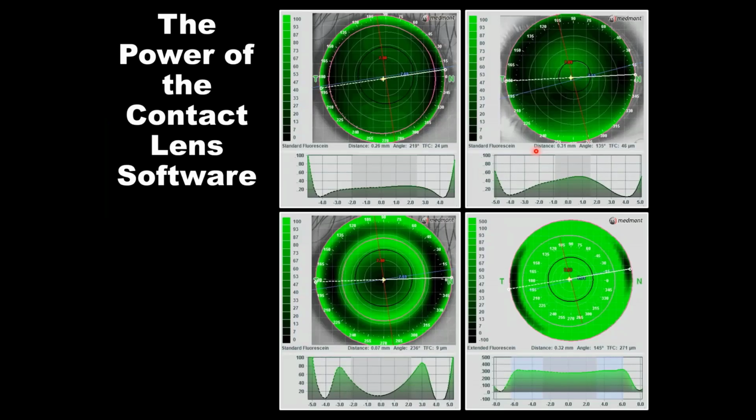Now, the contact lens software is this incredible tool that we've been discussing, and this session won't go into great detail on using it, but I wanted to encourage you to use some of the things we've discussed. Use that customized composite capture to create that large view of the eye and then take that to the contact lens software. If you're building an Ortho-K lens, take that optimized composite capture, convert it to the ideal eye, then build your orthokeratology lens.